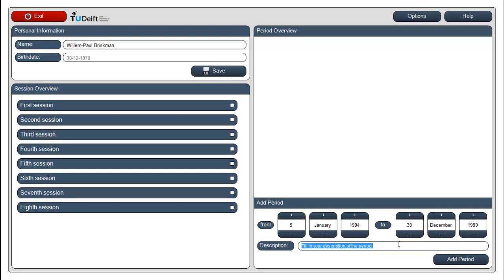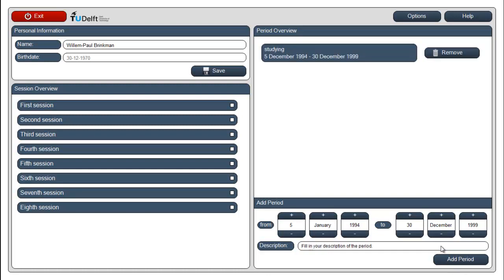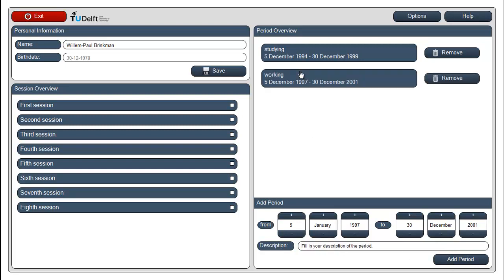So, all right. So here I've made one. So let's make another one. Working. I hope you have a more useful description. And you see, now I have already created two time periods in my life.